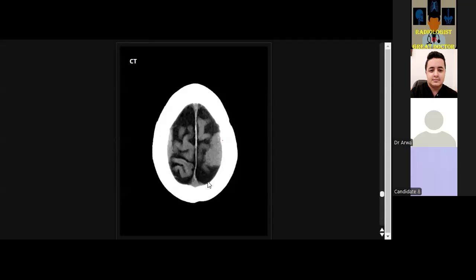Okay. Very good, boss. I remember this is a dural metastasis from prostate, by the way, not from breast. Okay. So primary tumors that send dural metastasis may be breast, prostate, lung. Very good, boss.